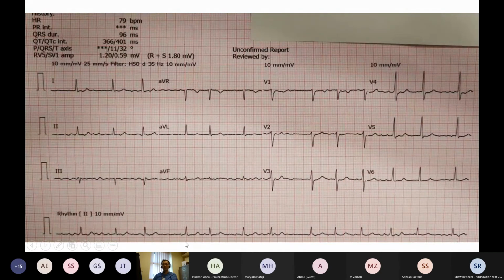So this is an example of atrial fibrillation. I hope that everybody is happy that there is an irregular baseline. There are things over here, for example, that you might say, oh, those look like P waves, but you can see that they aren't occurring regularly. So these are just the coarse atrial fibrillation sometimes looking a little bit like a P wave. Equally, you might say, is this atrial flutter when you see this over here? But atrial flutter waves look very, very regular. I think I've got one to show you later on, or if not, I've got one in the AF presentation I'll do for you at some point.